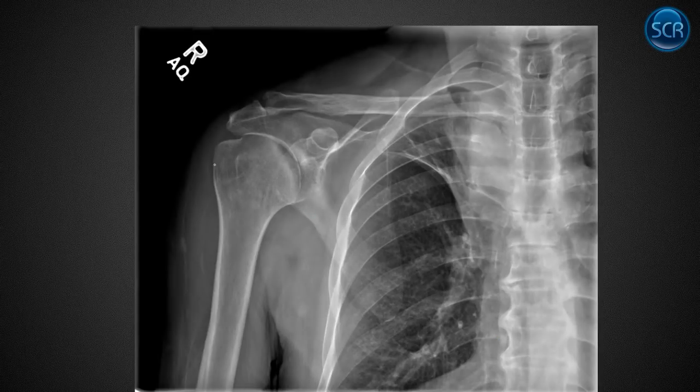What are we seeing in this one? The humeral head here doesn't look normal. We can't really see it, it's not a Grashey view. We can't see the glenohumeral joint that well, but the humeral head doesn't look normal. We've got this area of sclerosis with overlying lucency. This is AVN, right? It looks just like AVN in the hip. And the reason they have AVN is because the radiation port for their lung cancer came up through here.